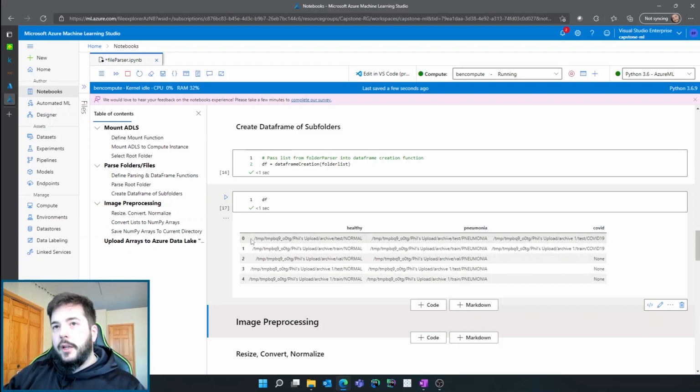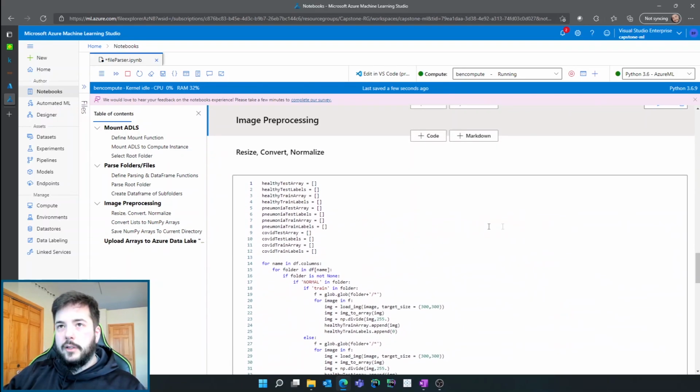Okay, so you can see that we have more folders for healthy and influenza pneumonia than we do COVID. It does not mean we have more data, but you can also see that we only have train and test data sets for COVID, whereas we don't have validation for COVID. So there's some balancing that we'll have to do later, but ultimately it's just an organizational thing.